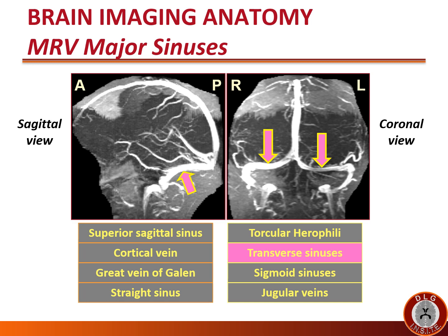The pink arrows point to the transverse sinuses that form in the folds of the tentorium cerebelli behind the cerebellum. In this patient, as is typical, the right transverse sinus is more prominent than the left transverse sinus, because the right transverse sinus typically receives blood from the superior sagittal sinus, which drains the large cerebral hemispheres, whereas the left transverse sinus typically drains blood from the straight sinus, which in turn drains blood from the smaller volume of tissue in the deep structures of the brain.